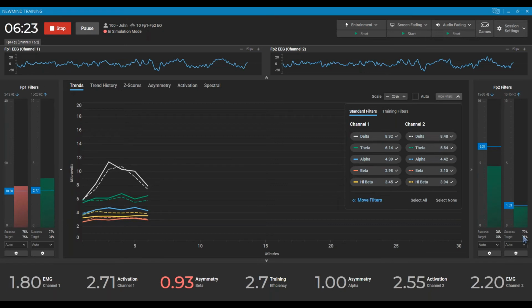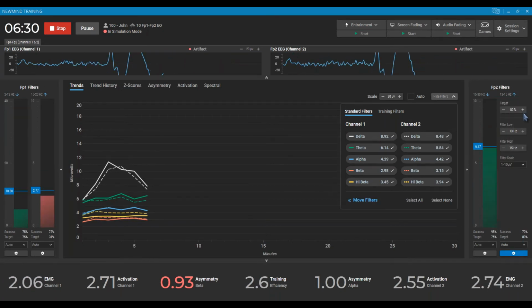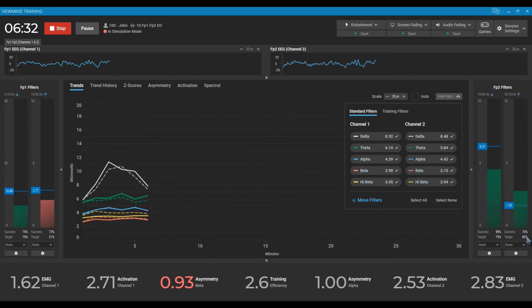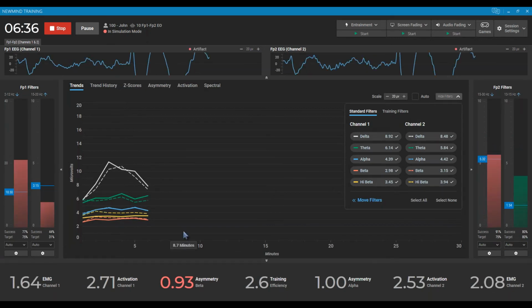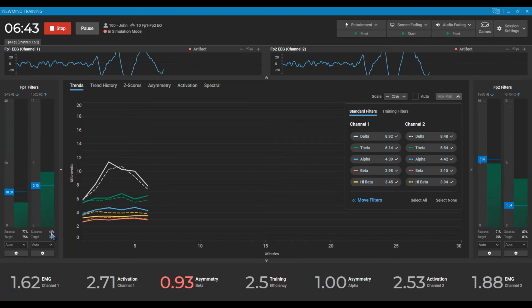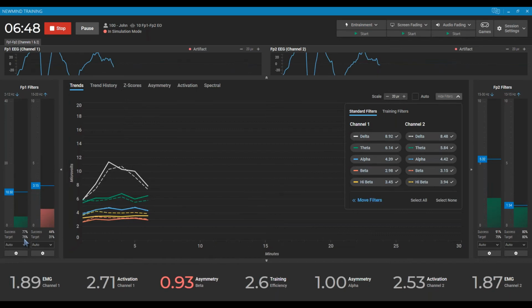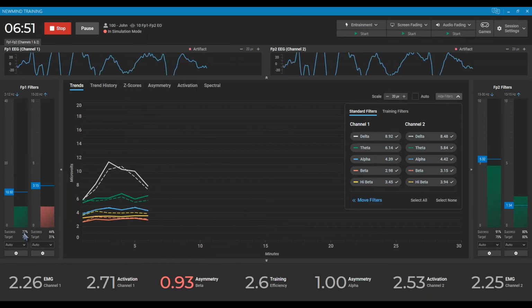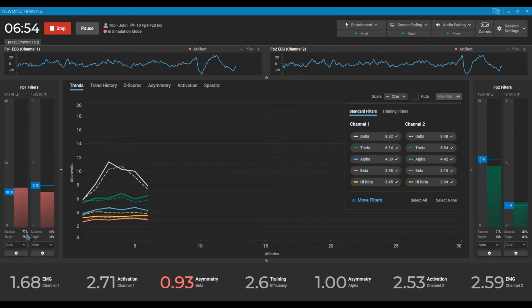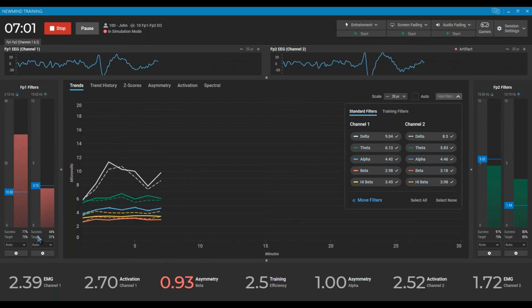Yes. And you can see here, and the last time I was on here presenting, I was talking about adjusting target percentages and exactly what Rob was saying in relationship to success percentages. To me, moving over to NewMind software after using BioExplorer for over a decade, this made me so happy. This is something that I always kind of wanted in BioExplorer. Was never able to really produce it.